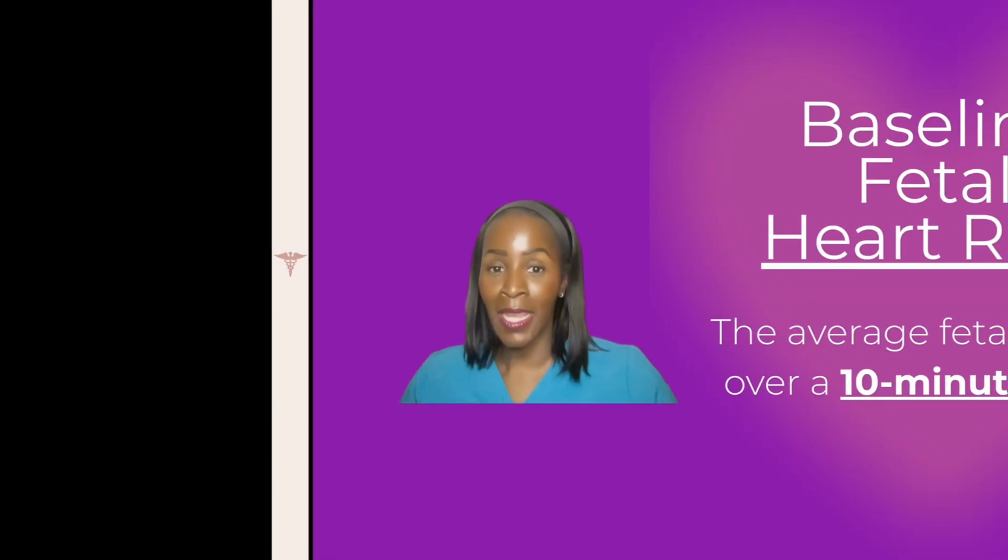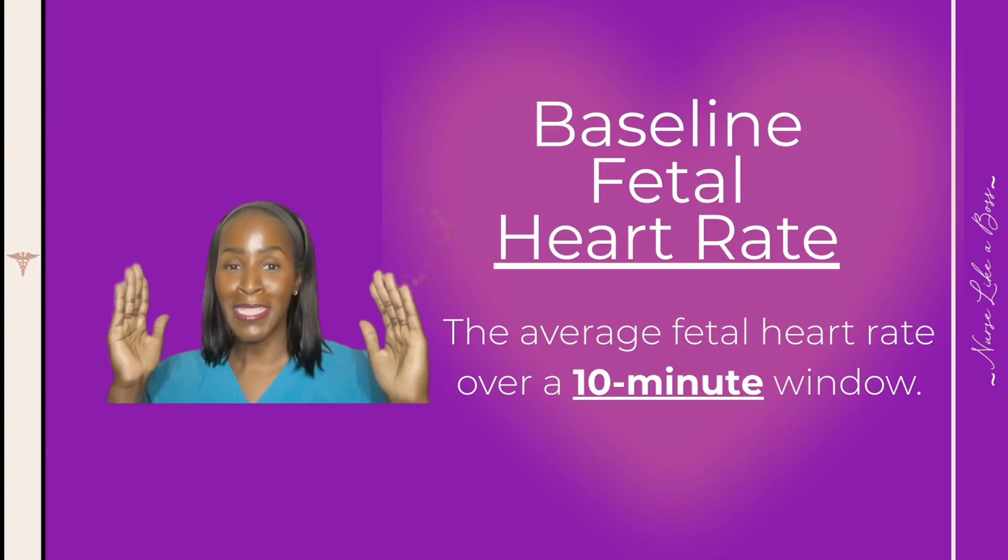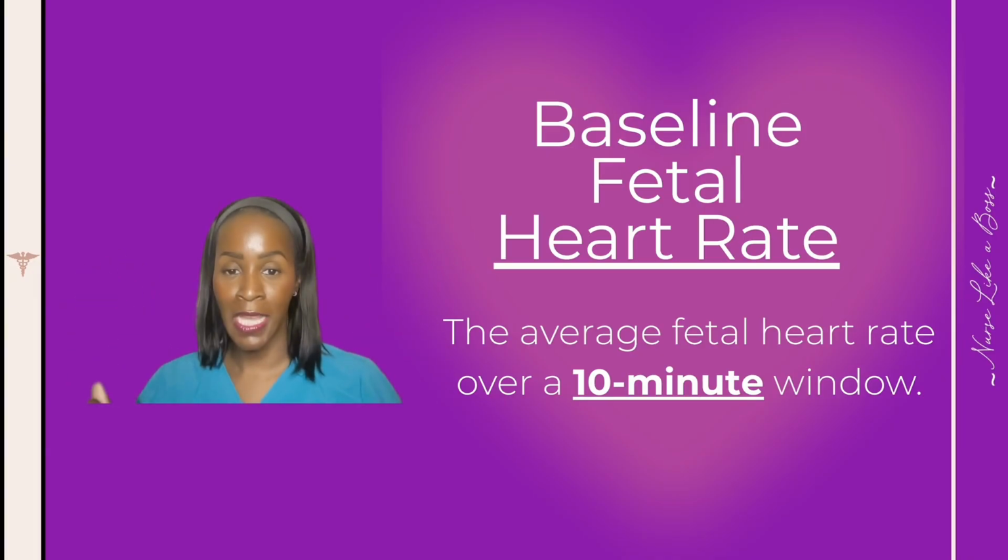To obtain a fetal heart rate, we need a 10-minute strip. Okay. We need 10 minutes in order to establish a baseline.